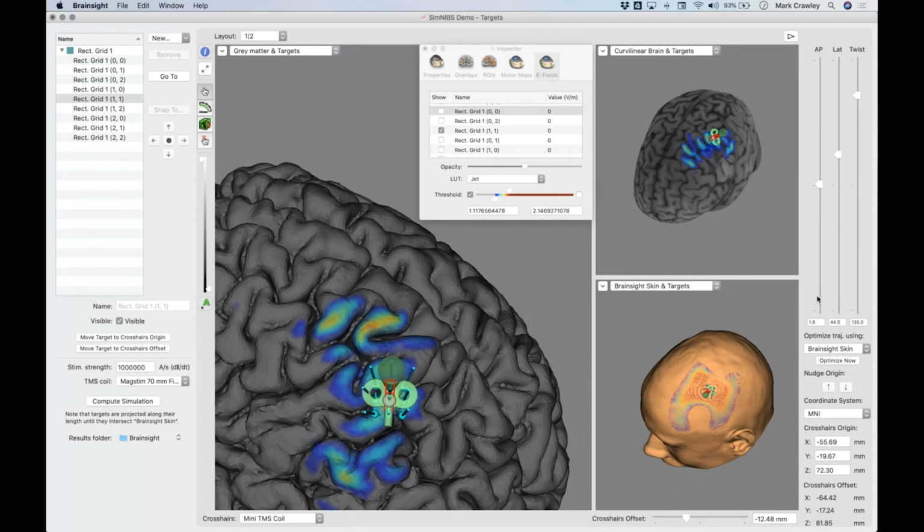Yeah, I should have made that explicit. Segmentation is not carried out by Brainsight. It's assumed that the user has done it previous to using this. Brainsight then just loads those segmentations, and so the maths is also SimNIBS, but the visualization is Brainsight now. But yeah, Rory's your man for asking that question.